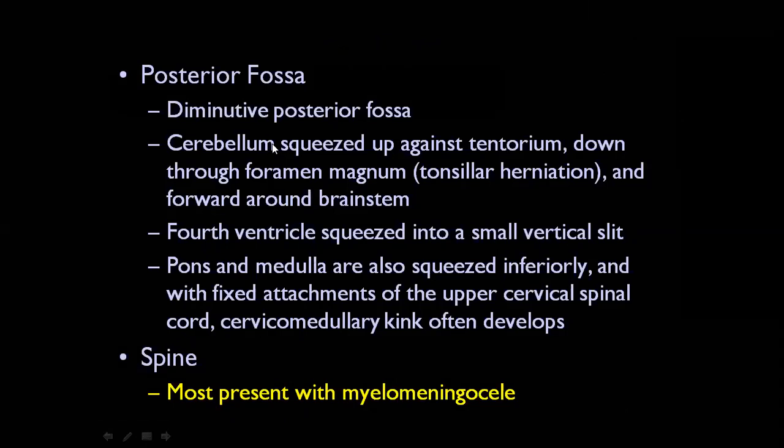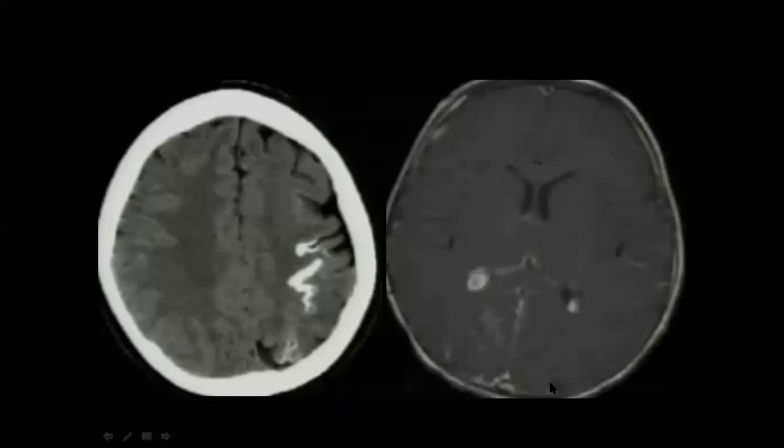All types of Chiari are very important in the exam. If they put something in the congenital, be sure that one of the important questions will be about Chiari. Okay. Let's check this one, and its differential.